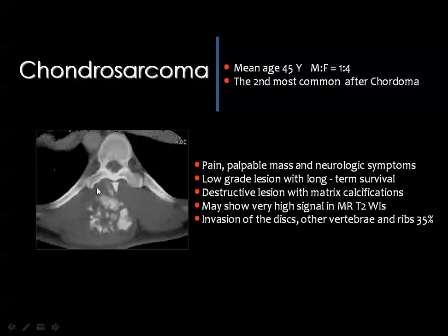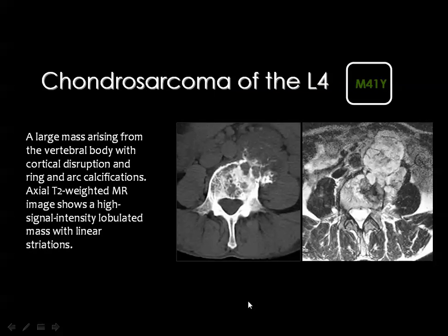And here you can see a lesion arising from the spinous process of one of the dorsal vertebrae, infiltrating the back muscles with dense areas of matrix calcification.